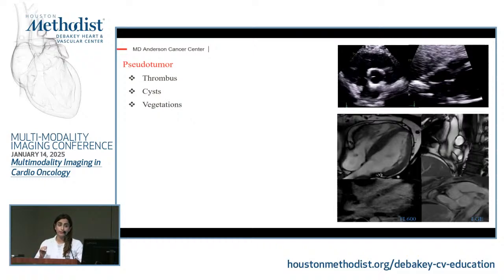They're very low attenuating. But a great deal of problems we see in the realm of cardio-oncology is thrombosis. So these patients have prothrombotic diseases that allow for them to clot, such as pancreatic cancers and GBMs. They clot. The moment you introduce a catheter, the amount of thrombosis you see on any catheter kind of gives it away.